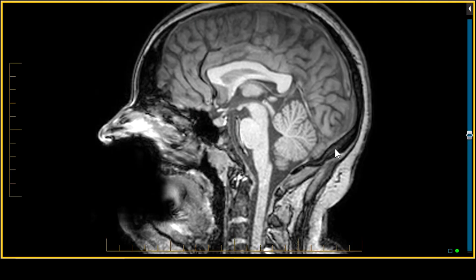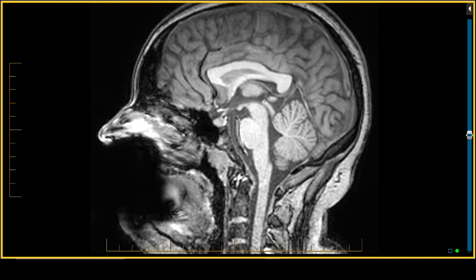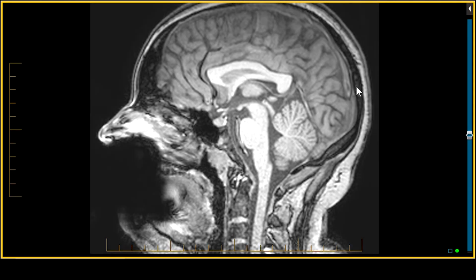I want to take a moment to talk about the skeleton on the sagittal midline view, since everybody gets a sagittal midline view for brain MR. We've got the diploic space, which has variable amounts of fat in it, especially in the midline, where it's pretty much devoid of fat, as you frequently volume average the sagittal suture. And the sutural volume averaging can produce this little dotted appearance. I'll make it a little lighter so you can see it, of the diploic space.